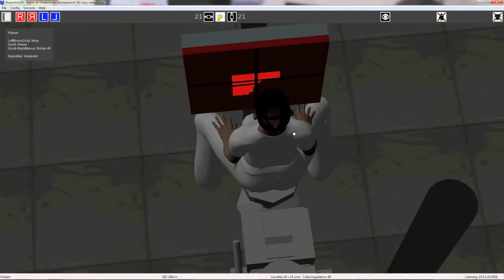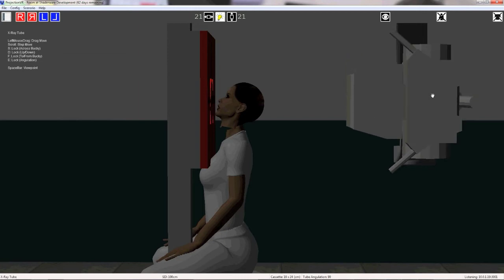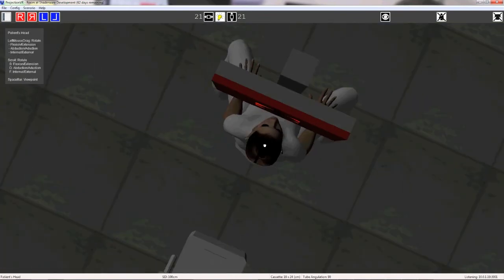It's not just the novice students that need some time getting hands-on experience. There can be a dearth of certain specific examinations during the 9 to 5 day. For example, most patients for facial bone studies arrive late at night when the students are rarely present. They may be intoxicated and uncooperative, not the ideal first experience for even a final year student. With Projection VR, you could run a workshop allowing all final year students to attempt the less common projections.